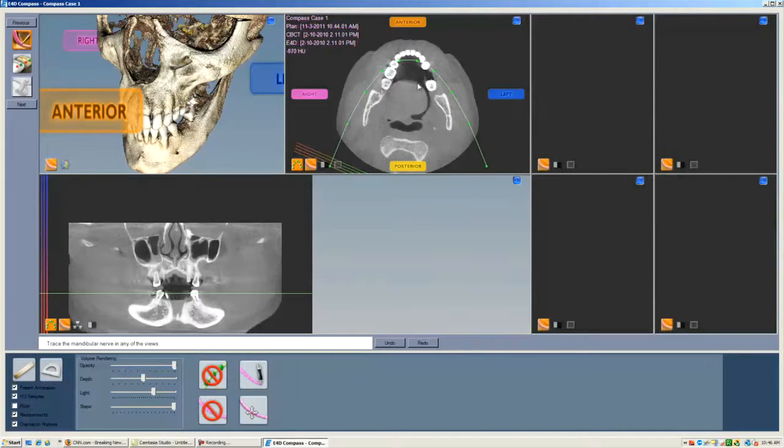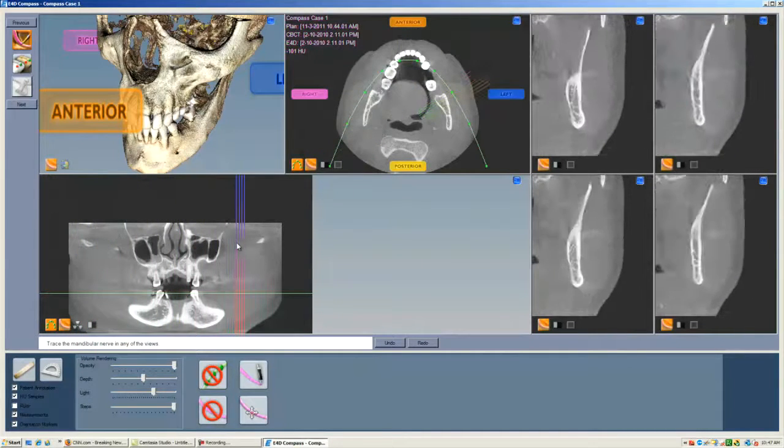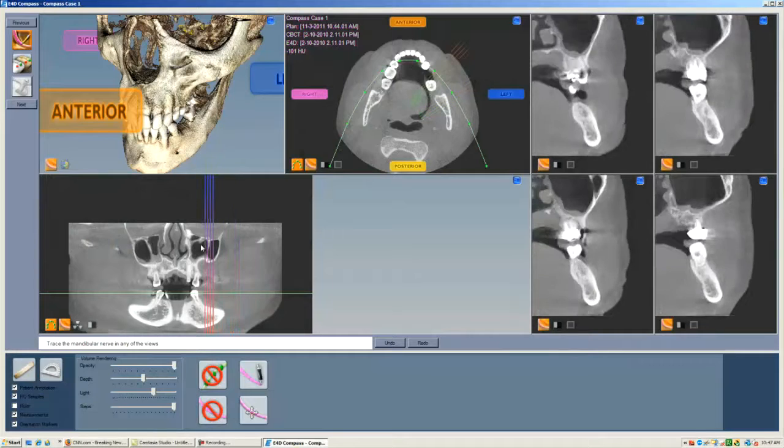Okay. I know you're about to show me, but why can't I see the slice views on the screen? Because the slice views are sitting off on the side and they haven't been invoked yet. So right mouse button down on the slice views, pull them over, and there your views come in on the right hand side. We do need these, and I'm going to show you how we use these.